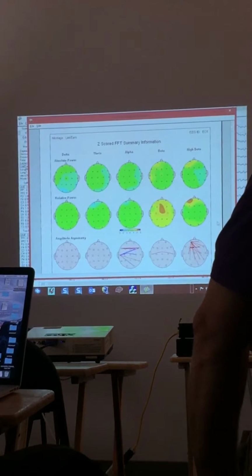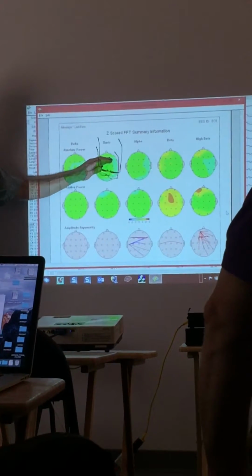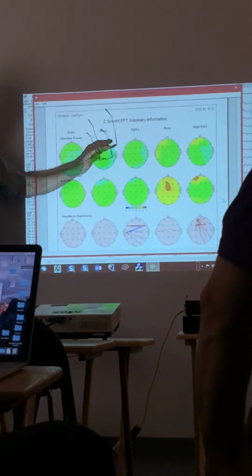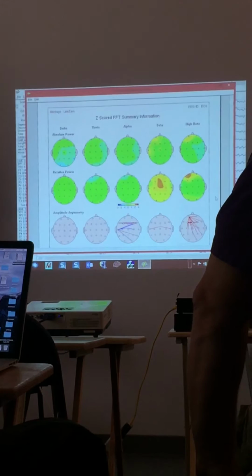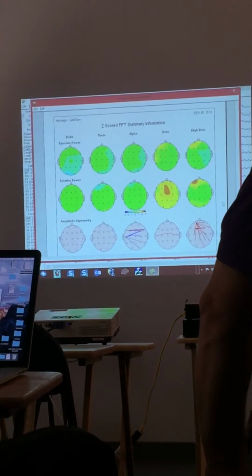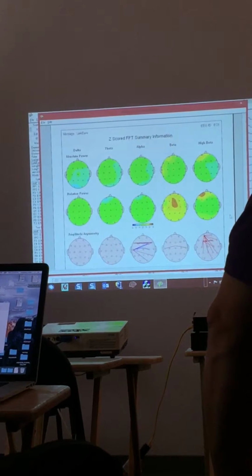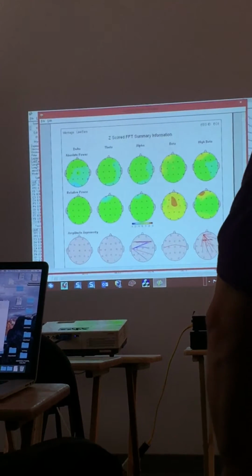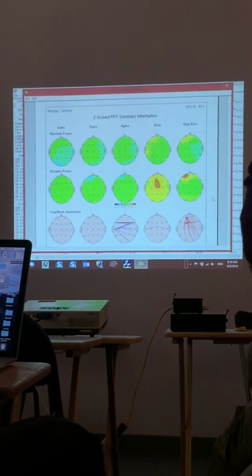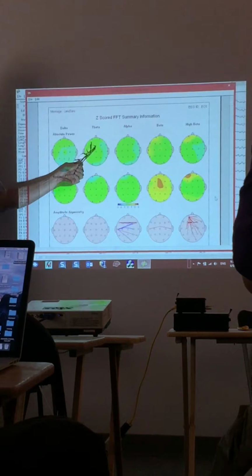So traditionally in EEG, we've always thought of excess theta, a lot of theta, to be associated with white matter damage in the brain. So if there's a lot of red there, too much theta, that means the brain's going slow. That means areas are damaged and the brain has to reroute information around damaged areas, which slows down processing. And so you see an excess of this theta.